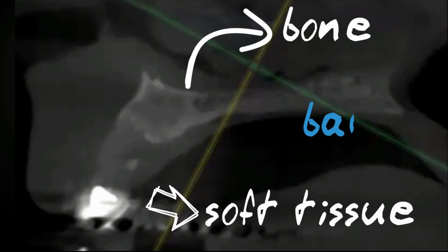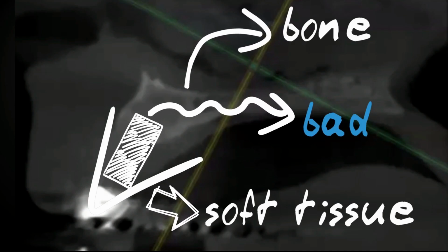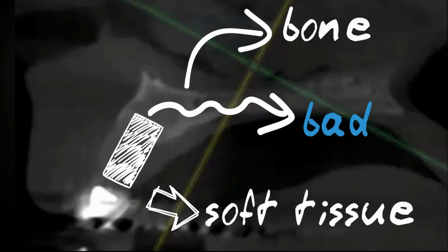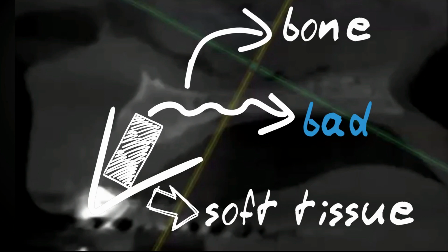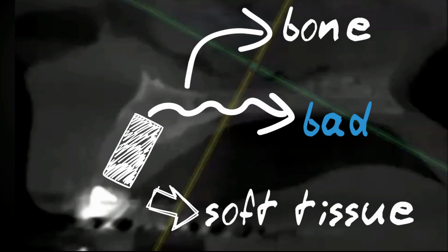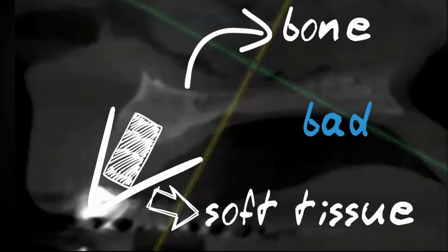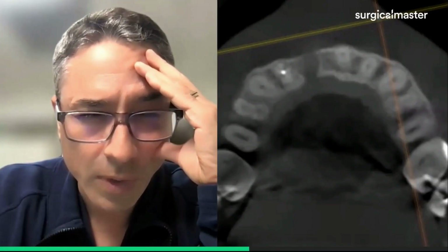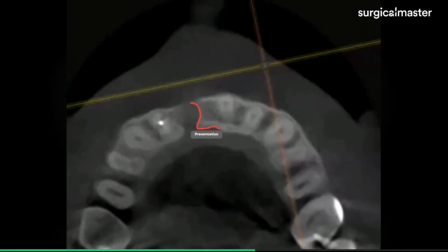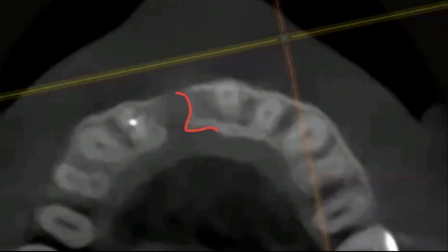So what's seen here in green could be soft tissue, it could be very poor quality bone, but I don't think we're there for an implant. I think this probably needs to be regrafted, and maybe that's what we are reviewing right now. What you're looking at here is one adjacent tooth is root canal treated. Rashad is drawing the outline for us on his screen.